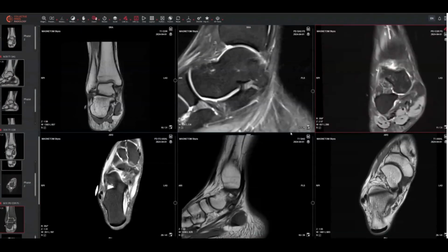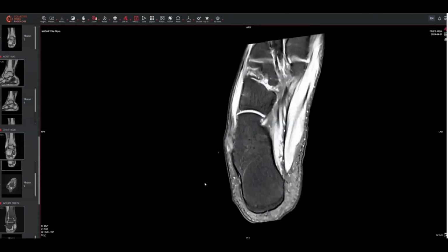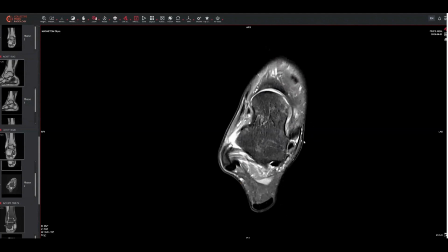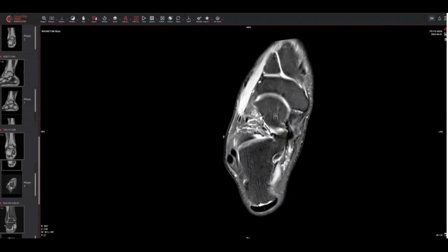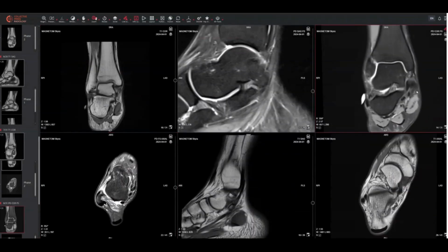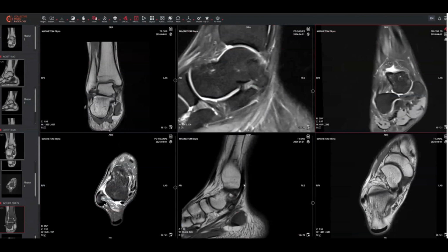When we're evaluating these cases, we want to understand how to make a checklist approach so that we can make sure to see all of the features of the case. In going through our soft tissue structures, of course, we're going to go through our medial, lateral, and extensor tendons, noticing that we have hypertrophic PT tendinosis and some mild tenosynovitis, some mild insertional PT tendinosis. We can see that also on coronal imaging. We'll be looking in this region. These images are slightly blurry and thick, so we underestimate the amount of tendinosis that's occurring there.